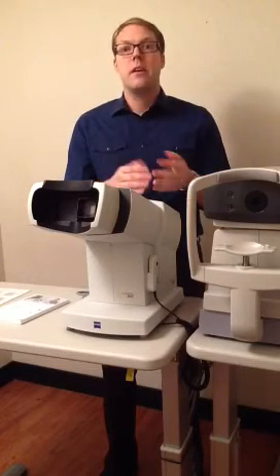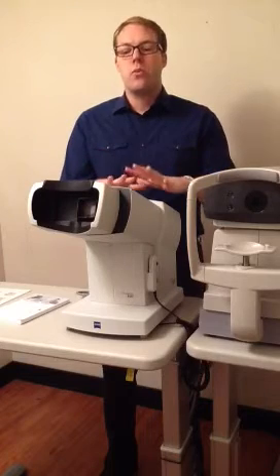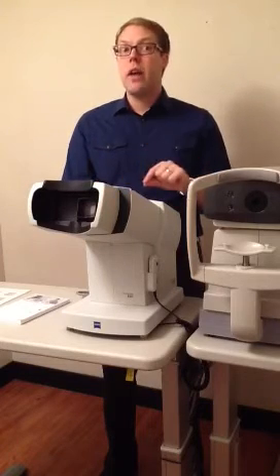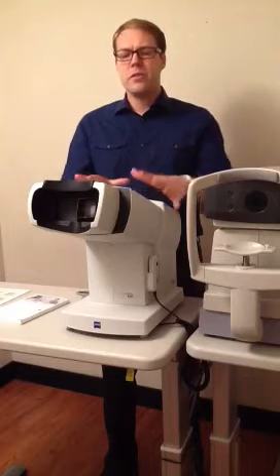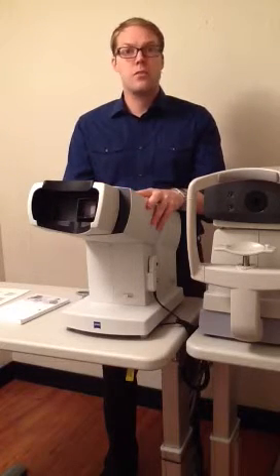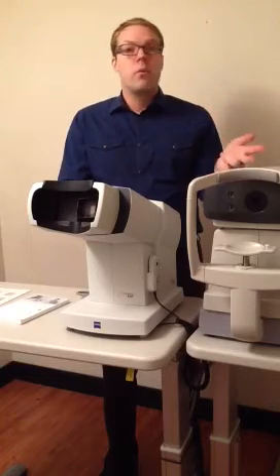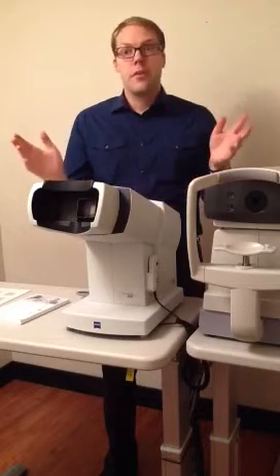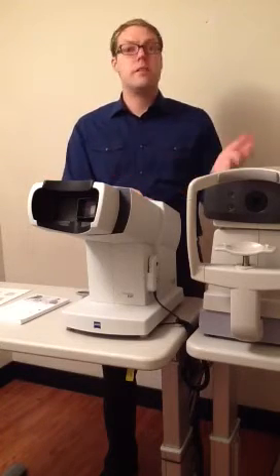One big quick sentence, but the problem is saying that much stuff in one sentence will cause them to check out, and they may not receive the message, and your words won't have the impact that they could have if we just slow down and add a little pause in between. So it checks for lots of different eye diseases and disorders like glaucoma, diabetic retinopathy, retinal detachment, and lots of others, and this machine can catch them in the really early stages.